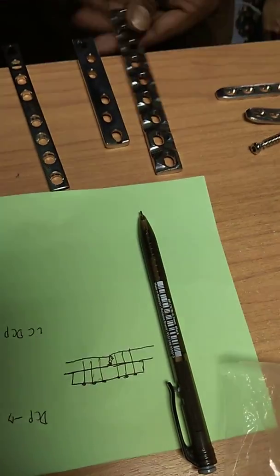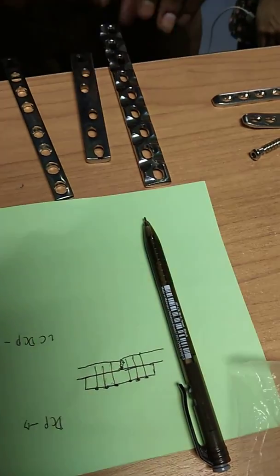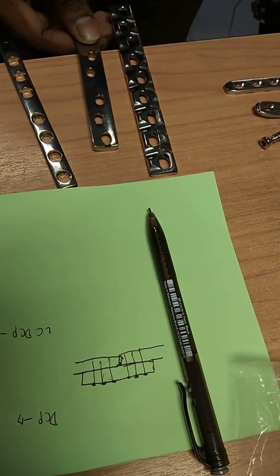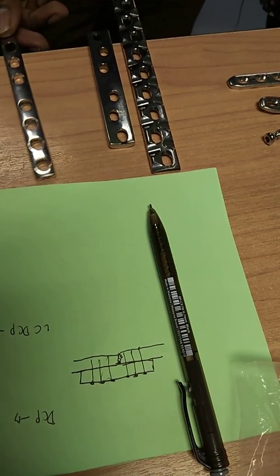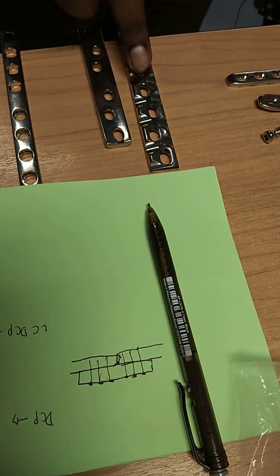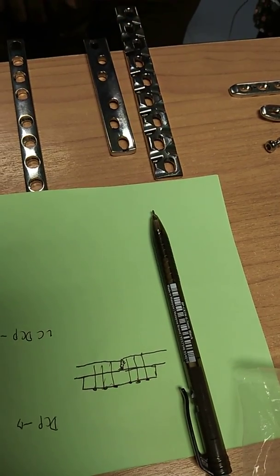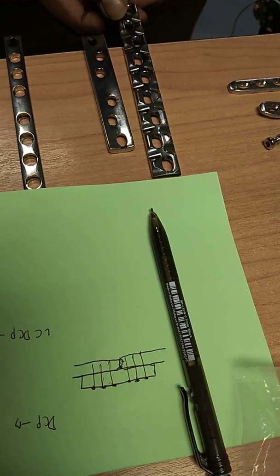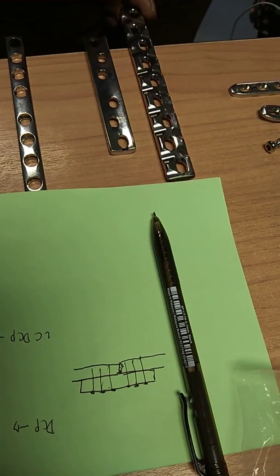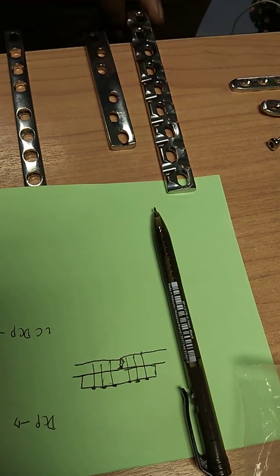Same thing, you're going to fix the bone, you're going to put the DCP on top. Blood supply, yes, because the blood supply of the bone comes from the periosteum. So, can you see the underpart of this normal DCP and the underpart of this DCP? This underpart of this LC DCP has minimal contact with the cortex surface to avoid further compromise to the periosteum on the bone, therefore reducing chances of blood compromise at the fractured bone.